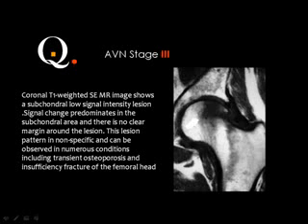Avascular necrosis. Do you see the line? It's very dangerous to diagnose avascular necrosis without the line. And you should have other imaging, other pulse sequences. This is T1, of course, and you should have the T2. You may get some brightness here, and you can easily see the line. If you are sure that there is a line here, then you start to diagnose avascular necrosis. If this is black in the T1 and bright in the T2, you can reach the diagnosis of stage 3.